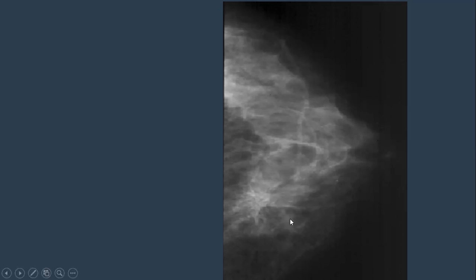Okay, it seemed to be toward the posterior. Mid to posterior, yes, posterior, I accept it. So now it is associated with pleomorphic microcalcification. If I told you this is screening and this is an incidental finding, you have to do a diagnostic mammography, and to see both craniocaudal and mediolateral oblique views, and to do a spot magnification view.